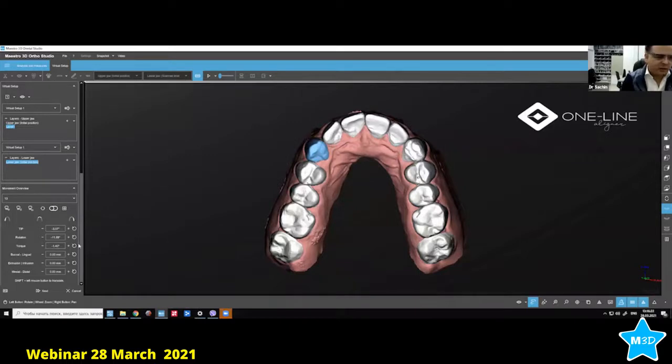I will not do all of it together right now. I'll do just, let's say, 6 weeks right now. The reason being, I want to do only 2 aligners in the beginning for the canine to go back to make space for the lateral incisor and for the canine. This is my standard protocol. So we've gone back 0.18. That'll be 0.20. Let's make it 0.30. So that's the IPR which I'll be needing between the canine and the premolar.